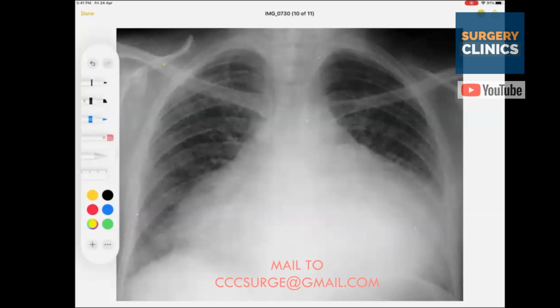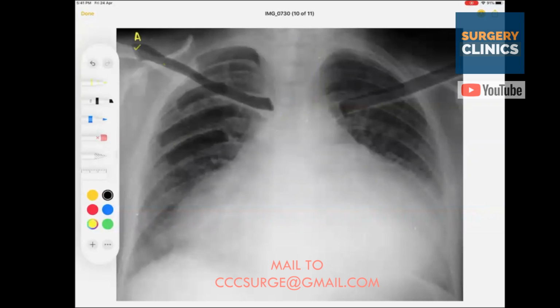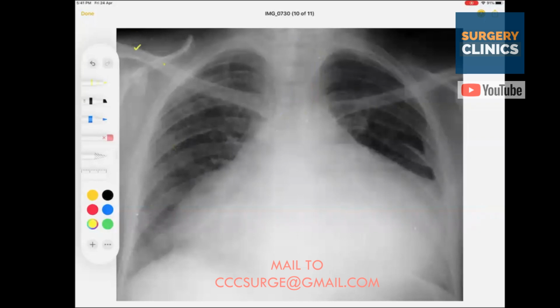Now, tell me very easily, A is this. So what is bad about A? Sir, there is nothing bad about A. Okay. Trachea is normal. Lungs are normal. A is okay. So let us put a tick on that. What about B? B is bones. Can you see any bones that are bad? Clavicles are okay. Ribs. Okay. I cannot see. So that means, if A is okay, B is okay.